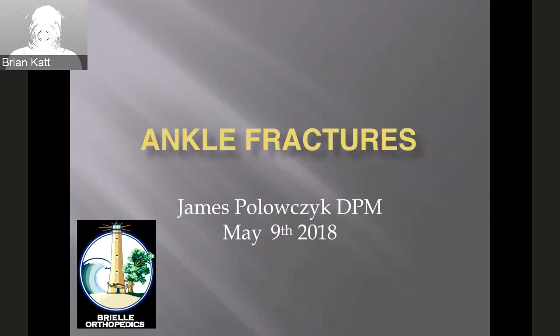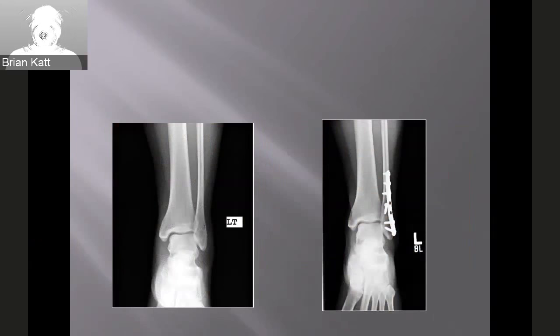We'll go through ankle fractures real quick. I know there's a lot of slides on this, but don't worry, it won't take too long to go through. So we'll look at a bunch of different fractures today. I think Katie, you may remember this one. I mean, even I'm no genius, but even I can figure out that this needs to be fixed sooner rather than later. And then we'll talk a little bit about the thought process behind why this one ended up getting fixed here as well.